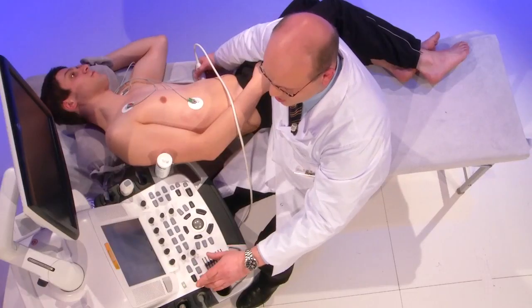I thought it might be interesting to show you how this can be used also in pathology. Therefore, I brought you a stress echo case, and there I usually take tissue Doppler data during the stress echo examination. And if you're not sure what you should think about the result of this stress echo, you can use the underlying tissue Doppler data and analyze the strain curves and see what's going on with the patient. So I'm going to switch now to this other patient.